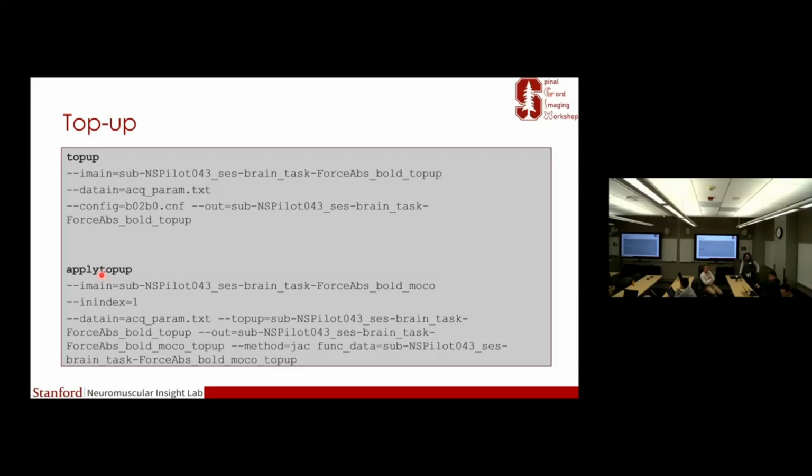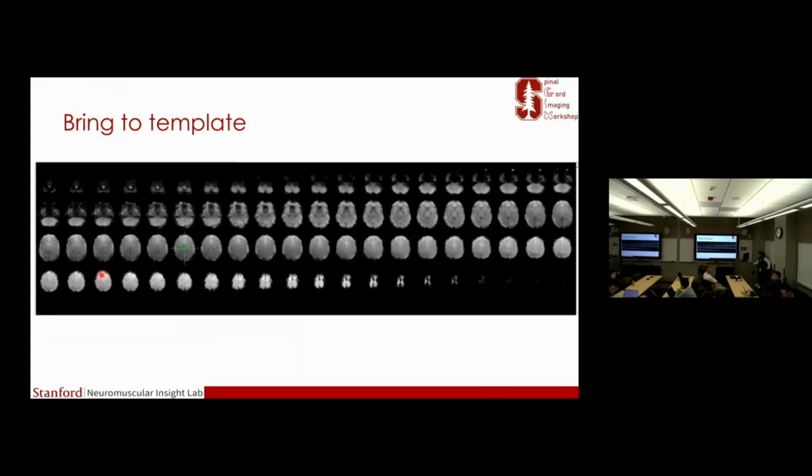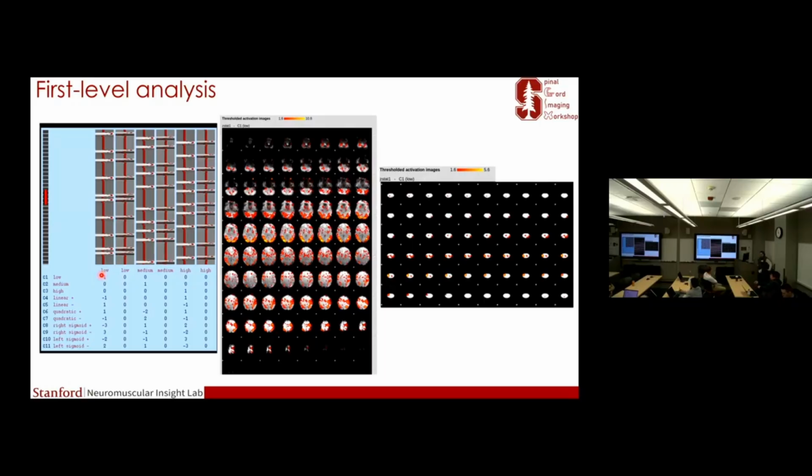I don't know how many slices are in the data. Well, 30 and 15. This is why we have a custom slice timing file, for example, because we don't do the regular odd or interleaved order. We know the slice timing and we input that to our slice timing or PNM to make sure everything is correct. And the volume time of acquisition for the entire volume is 2.5 seconds. We can probably push it a little shorter.